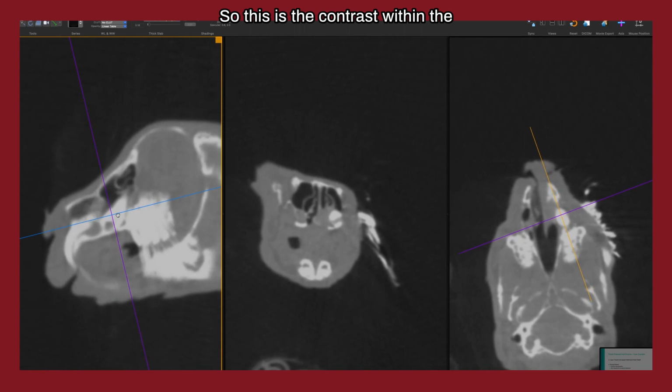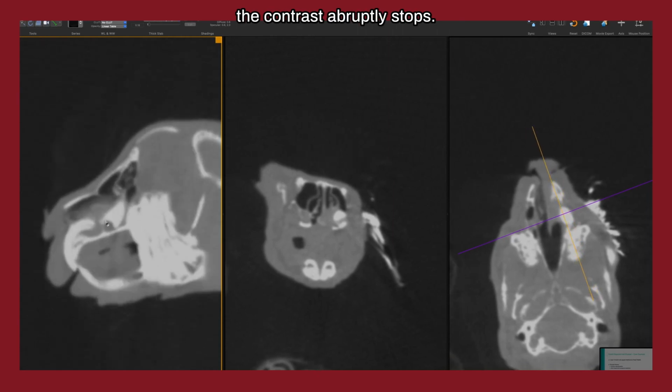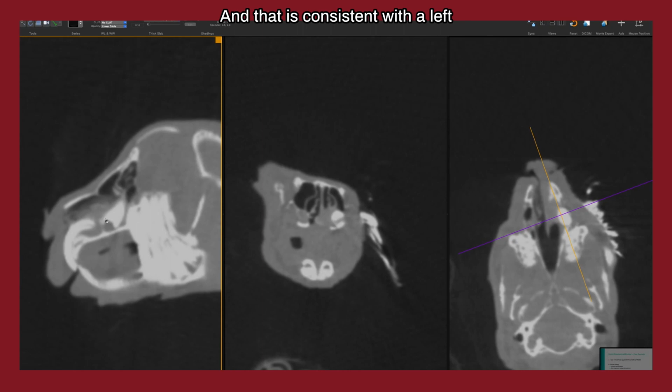So this is the contrast within the nasolacrimal duct, and we can see that right at the level of this tooth root abscess, the contrast abruptly stops. And that is consistent with a left-sided nasolacrimal duct obstruction secondary to a tooth root abscess associated with the left maxillary first incisor, or tooth 201.